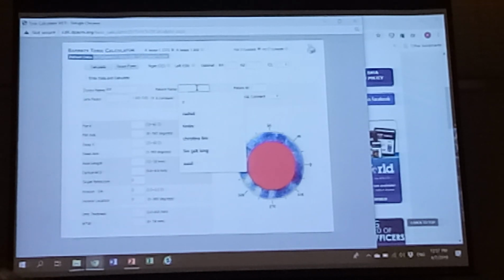And now you press toric IOL at the top. You see that button, toric IOL? And that has now given you a number. What has it told you to use now? And you will see at the bottom it gives you the names of the three instruments you applied. That tells you it used three sets of K data to get a triple optimized K that you use for your toric calculation. And you see, it asks you to use a T2 or a T3. T2 to get the lowest residual astigmatism.